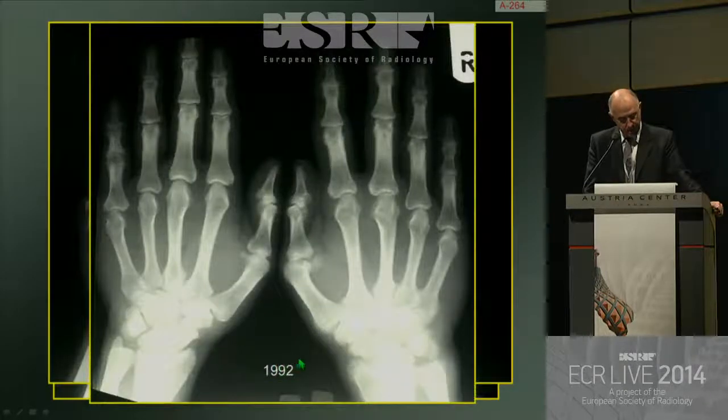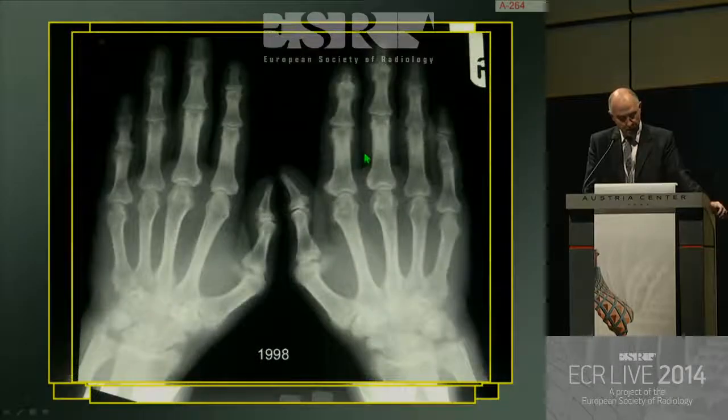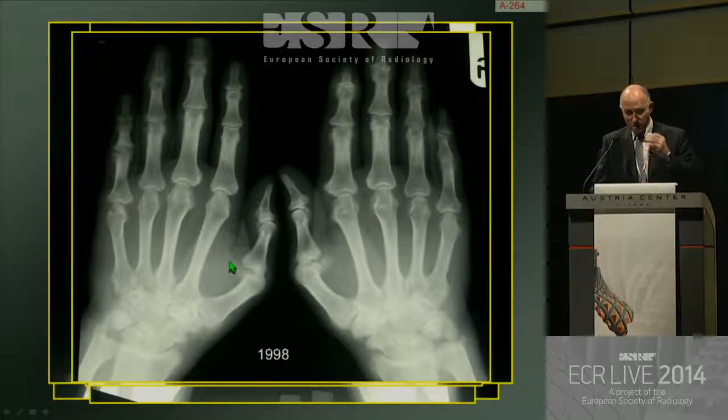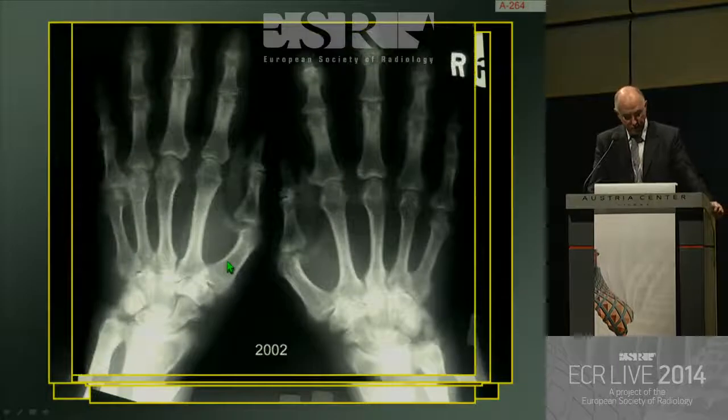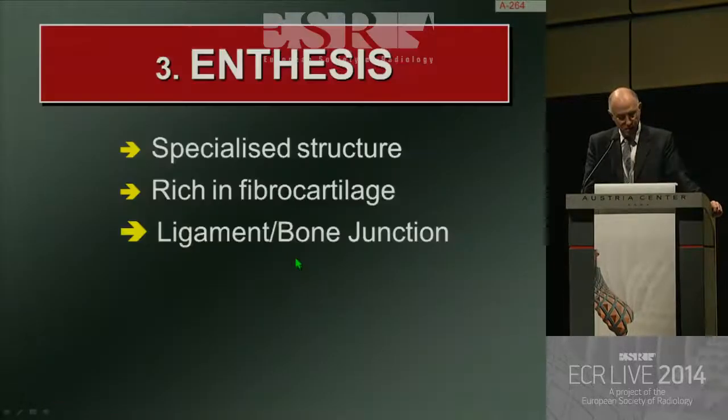And then a few years after that, there's more new bone formation, and some new bone formation starts forming along the diaphyses of these digits. And then a few years later, the other sesamoid bone gets bigger, and you start having more new bone formation, the so-called dactylitis phase. And notice once again, not only is the sesamoid much larger, but there's now more new bone formation here. And this is absolutely typical. This is what I meant by, please ask yourself, is there new bone formation of a psoriatic involvement? It is not just synovitis, but also starts to involve the adjacent ligamentous and tendinous attachment.